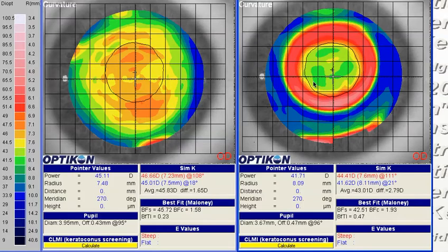I think that, along with some neuroadaptation, is probably taking care of the complaint of glare, but the issue of the unsatisfactory visual acuity still remains. Looking at the pre-wear topography, it looks like the corneal toricity extends over a pretty broad range of the cornea, and I believe the OR after dispensing shows there's still a diopter and 3/4 of cylinder that is not corrected.